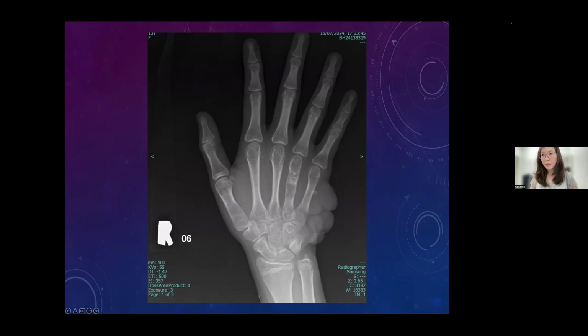So when you found it, then you have to look at the bone as well. This is a hand X-ray, right? When you look at the bone, outline it one by one. No trauma, meaning most likely there's no fracture. So now we have to look for bony pathology. Look at one by one, then you see on this fourth metacarpal bone, do you see an expansile lytic lesion here?